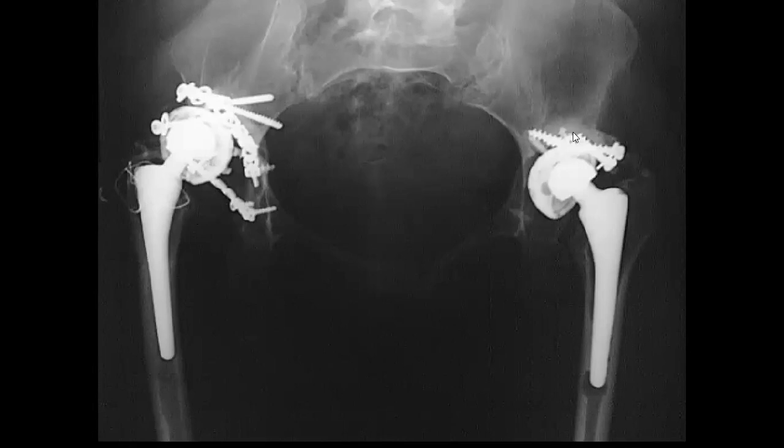But you will add what is linked to the prosthesis. So either you are going to find complications of the prosthesis, like loosening or fractures or infection. One of the most important complications of the prosthesis to know is something called particle disease.